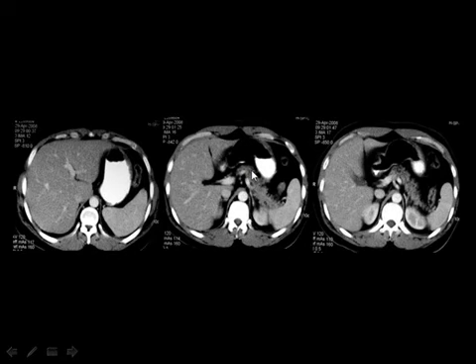You don't see the head of the pancreas because it is located lower down. And here you can see the liver, the spleen, the tail and the body of the pancreas, the aorta and the inferior vena cava, as well as the beginning of the gallbladder. And also in this section, you can see the start of the left kidney and the start of the right kidney.